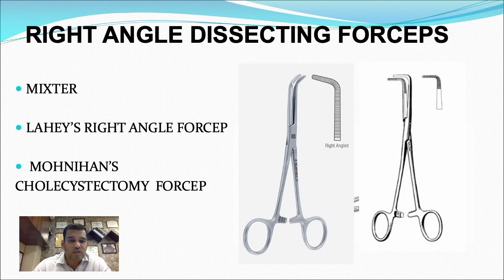This is an atraumatic instrument. You do not hold the structure, but you hook around the structure and then you can ligate. How do you sterilize? It remains the same, that is autoclaving.